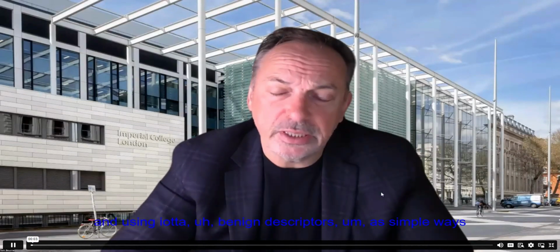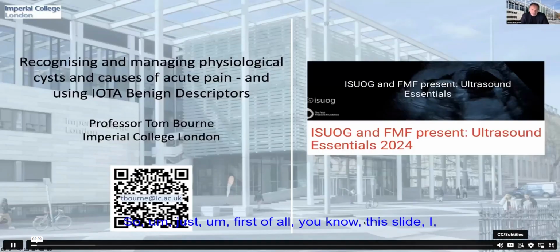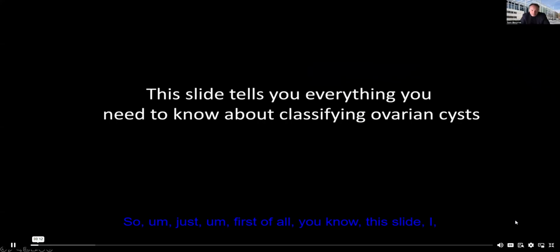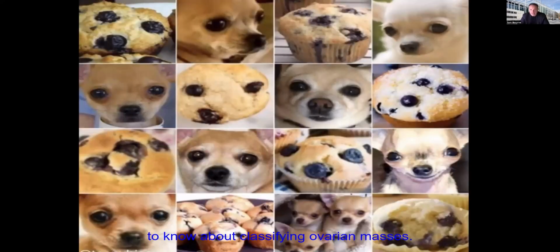Okay, so I'm going to talk about physiological cysts and using IOTA benign descriptors as simple ways of classifying ovarian masses. So just first of all, this slide is one of my favorite slides. It tells you everything you need to know about classifying ovarian masses. Here we go. You've got a blueberry muffin, you've got a Chihuahua.